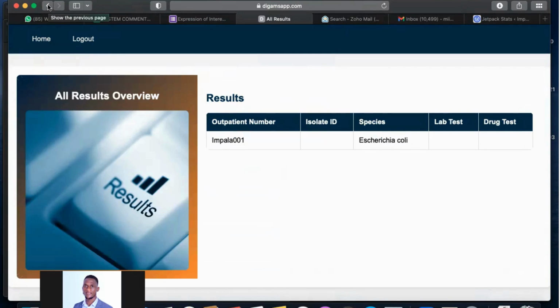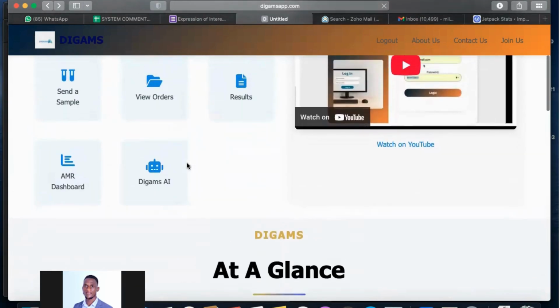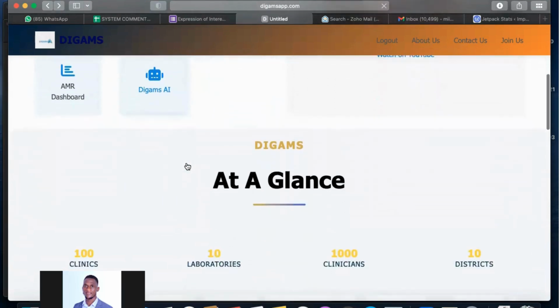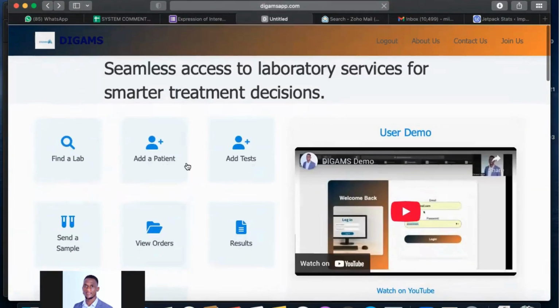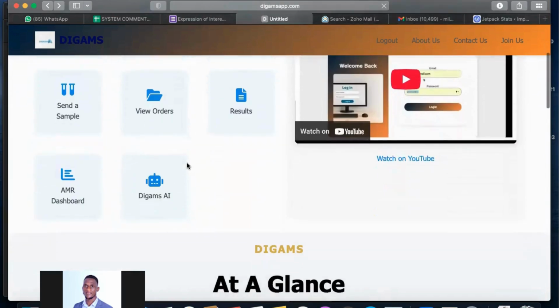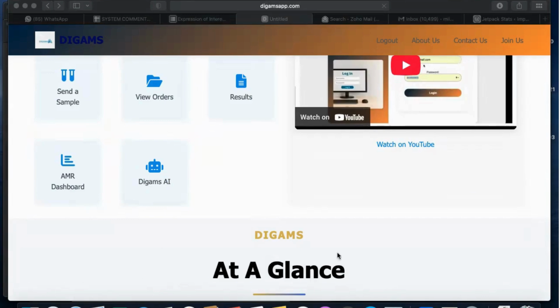Yeah, so this is an automatic system whereby, even for your particular case, for tests that you've received, if you perform any actions on them, the lab or the facility that has sent those tests to you is going to be able to check the progress that you're making with the various tests sent to your lab.